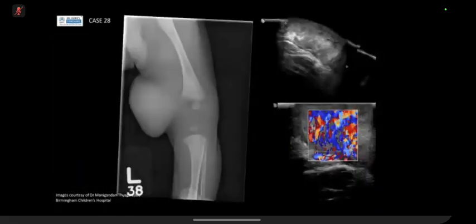So these are hemangiomas. Often they present, you can have congenital forms which present at birth, or you can have those that present a bit later in life. So this is purely soft tissue, like what candidate 4 mentioned, no bony involvement, and on ultrasound it can be quite a heterogeneous lesion, quite well circumscribed because hemangiomas are vascular tumors. Okay. They can be compressible, but sometimes they're not so compressible. The more compressible ones tend to be vascular malformations, like veno-lymphatic malformations, where they've got more cystic spaces. And the key thing is that hemangiomas are often very richly vascular.